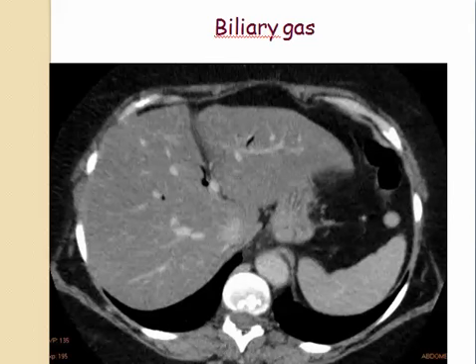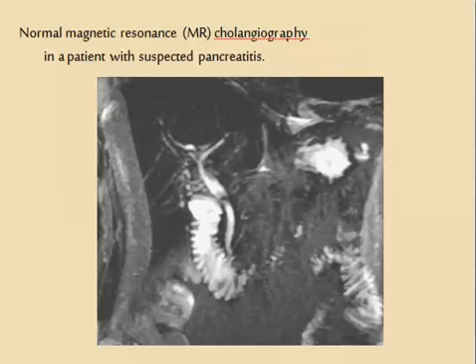Here is the appearance of biliary gas. Here is a normal MRCP, MR cholangiography in a patient with suspected pancreatitis.